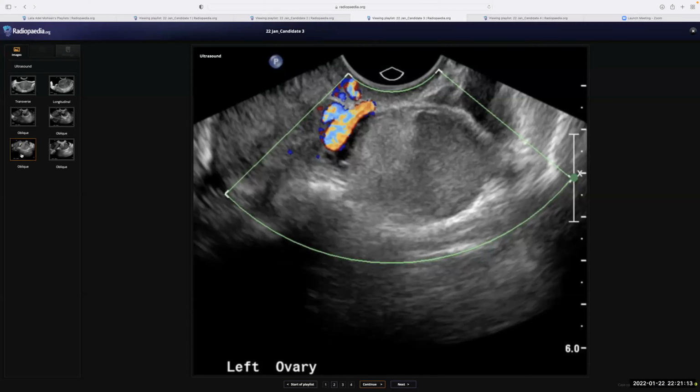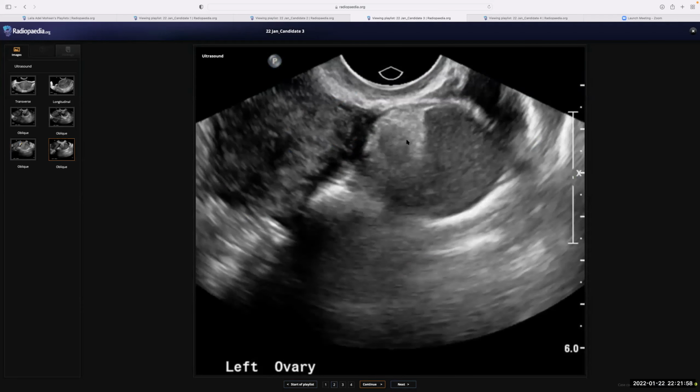I will check the clinical picture of the patient, if the patient has a fever or the lab markers like CRP and sedimentation are high. If the inflammatory markers are high, that favors abscess, and if they are normal, not. Because of the loss of color coding within the mass, let me think of volvulus of the ovary, and this is an emergency, and I will pick up the phone and tell the referring clinician about the situation. Okay, what do you think of this image here?